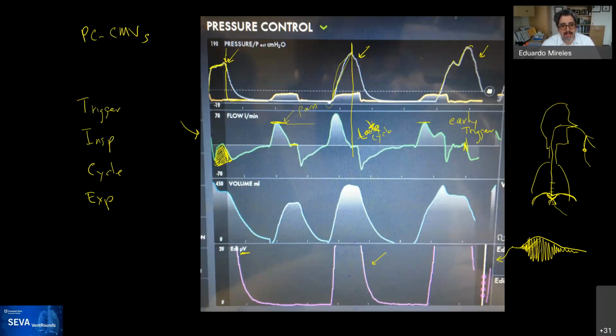So esophageal pressure may be better under those circumstances because you may detect other activity that you could then potentially see. What I could ascertain in this case is the activity of other muscles leading to aberrations on the waveform that you're seeing over here.